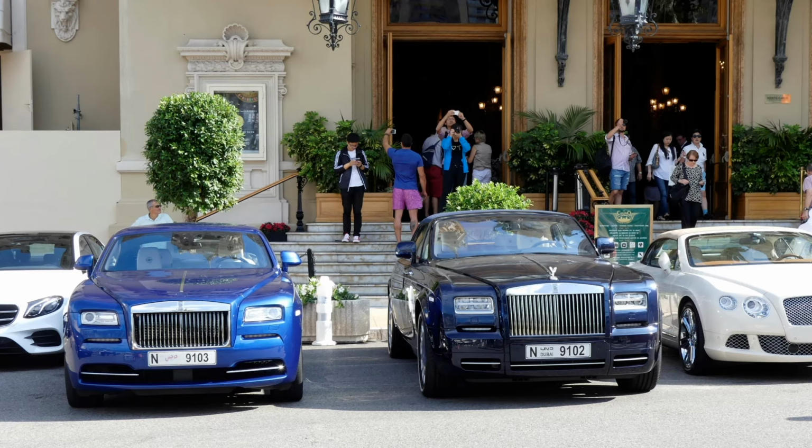This image is obviously not a radiograph. All the radiographs are pictures. This is also a picture. So let's see if we can harvest some information from this picture. A few years ago, I took this picture. We can see the front of a building, probably a tourist area. I think it is a tourist area because I see several people taking pictures.